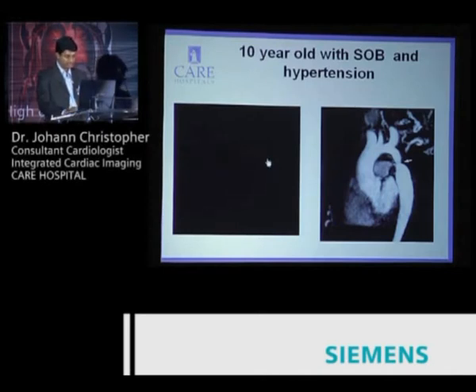And this is also to show you the VEC imaging which we were talking about. And we are able to calculate the gradient. So many times in echo, because of the angulation, it's not possible to accurately have a Doppler lined exactly right. So for severity of coarctation in a child who is being systematically evaluated, especially a moderate degree, MR gives a good picture.